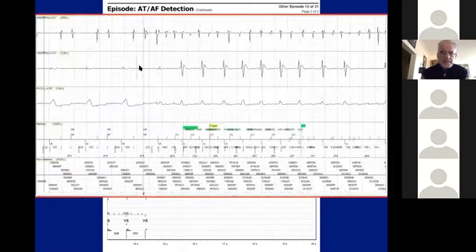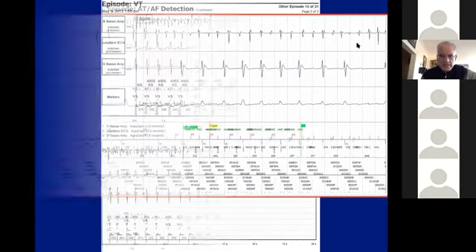So this is the same event enlarged. You can actually see that there's a slight prolongation in this timing, a slight lengthening of the period between the retrograde conduction and the delivered A-paced event, and that became proarrhythmic enough to trigger this atrial fibrillation. Let's see what happens next.